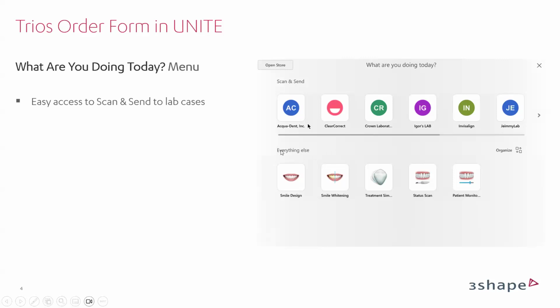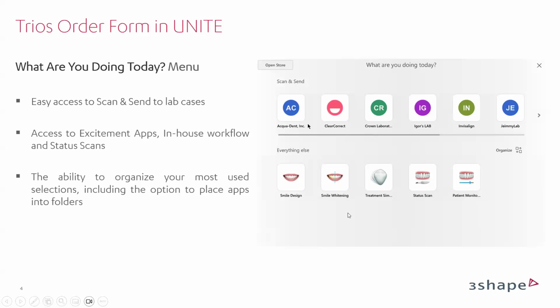Also, you may choose the exciting apps that are located here. It means that you may use Smile Design, Smile Whitening, also Treatment Simulator, Status Scan, and Patient Monitoring apps if needed, of course. Also, you will have the ability to organize your selections, including the option to place the apps into folders as well. And you will also have a new guided order form.